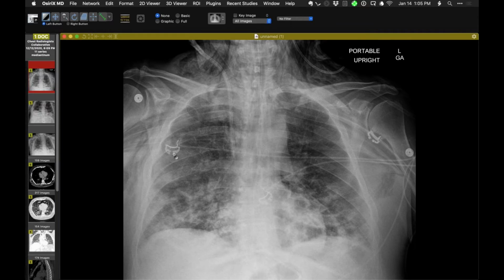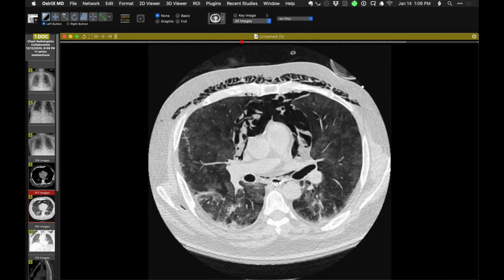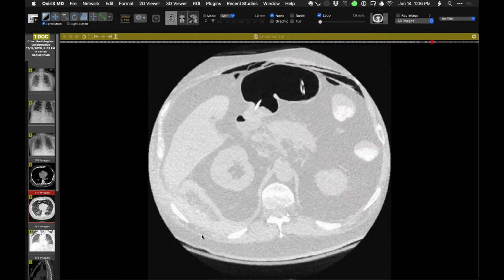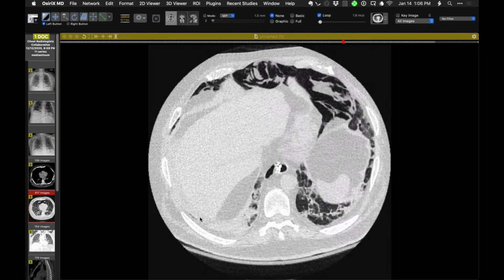As best I can remember, this was probably ascribed to the Macklin phenomenon, but it was not a trauma patient, and it's also not a patient with intra-abdominal disease. So the point of showing this, and I'll now show you the abdominal CT so that you can see the distribution of air, but particularly the air in the upper abdomen. Here you can see where the air is in the upper abdomen.